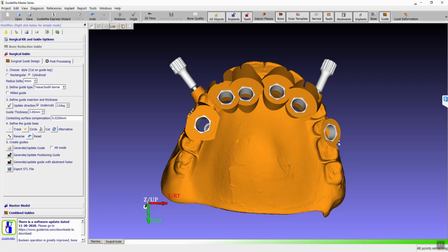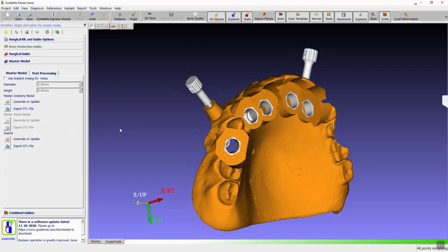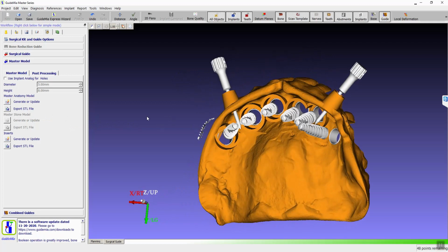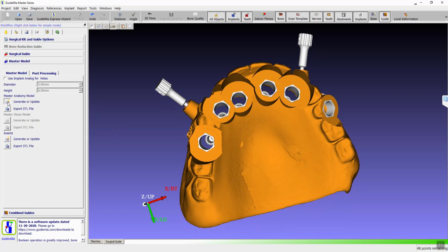Then another thing is tissue, right? We have talked about that. You can actually generate tissue yourself, so we can do that here too. But for this case, because the bone model has nothing on the posterior, this may end up with something not that great for the tissue, because we don't even have bone here. Well, we'll give it a try. Let's see. Roll the dice.